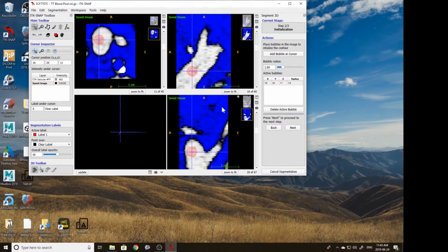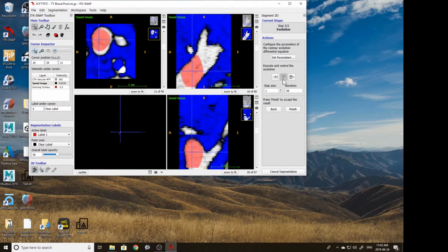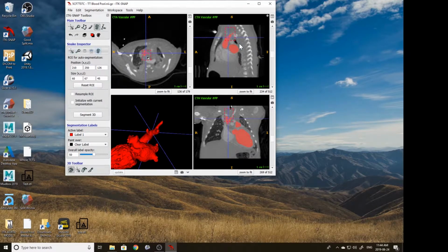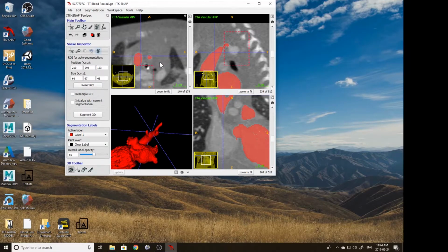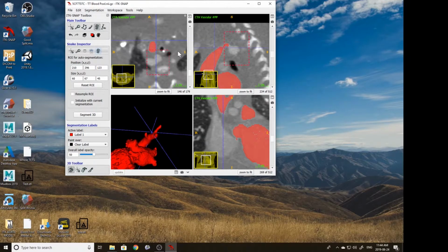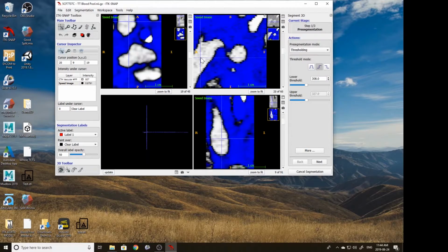Creating the bubble, and then I wanted to shrink it down a little bit because it was near the edge on some of the views. And here I believe, oh, there we go. Update the model again. Here we can see that coarctation of the aorta, where it just gets super tiny, right at the top of the aorta. You can really imagine how that would stop blood flow going to the body. So that'll be what we want to show in the model later on when we're doing that editing.